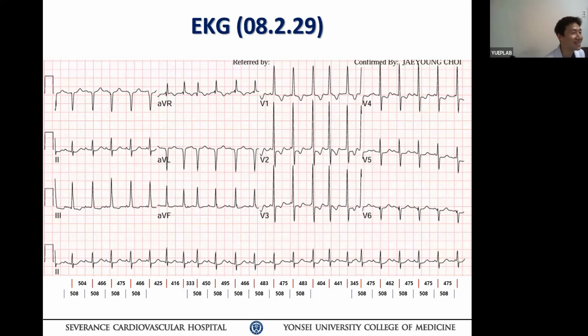Dr. Om is here. How can we differentiate this? We meant the TP interval is pretty short. Is it sinus tachycardia or atrial tachycardia? How can we differentiate? It is important to observe the pattern of the diurnal variation. With sinus tachycardia, the heart rate is slowly going up, warming up. However, in atrial tachycardia, there is sudden onset; the heart rate increases suddenly, and after 40 minutes drops down suddenly.